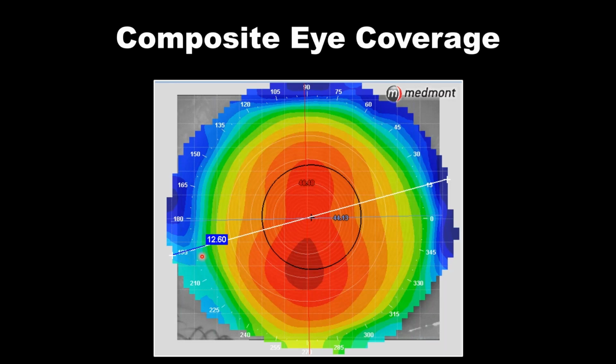Now, do you need to do a composite map for a screening? A patient comes in with slightly reduced quality of vision. Maybe they're not able to get quite to 6/6 vision. So you want an assessment of what's happening within the pupil, and whether there's any apex that's decentered from the cap of the cornea. Now, you really don't need a composite map for that. The extra imaging, the time that it takes to take the composite isn't that much greater, but nevertheless, we just want a screening. So in that case, just do a single topography capture.